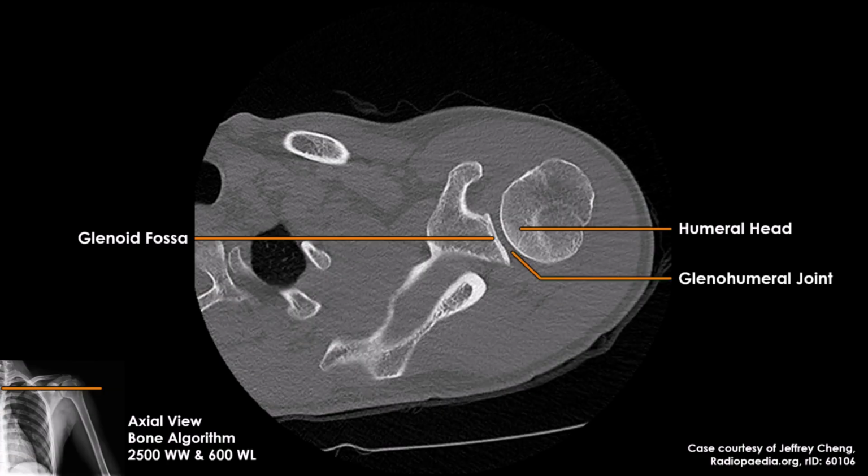We can see several other features of the scapula now. This flat area is the scapular body. This is the part of the scapula that forms the triangle shape. This anterior projection of the scapula is again called the coracoid process. Several muscles attach to this point.